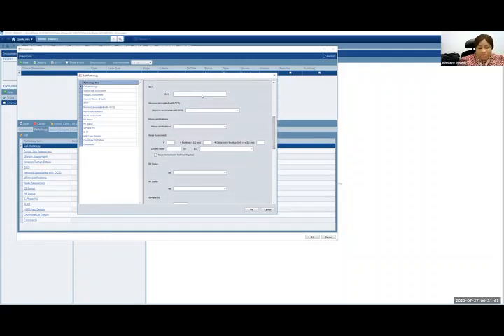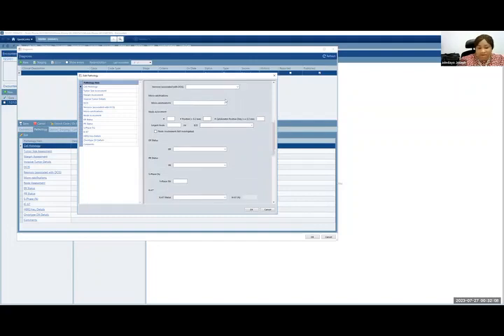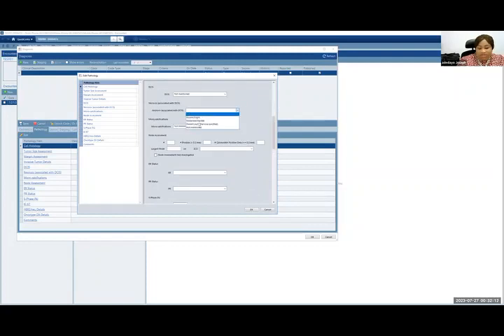So going forward, again, you can talk about DCIS and the same options. Is it minimal, moderate, extensive? Has the report just said DCIS present and not otherwise specified? Is DCIS specifically absent, or was DCIS not mentioned? So we can say it was not mentioned, and that is that. Are there microcalcifications? Not mentioned. Necrosis associated with DCIS? Not mentioned.